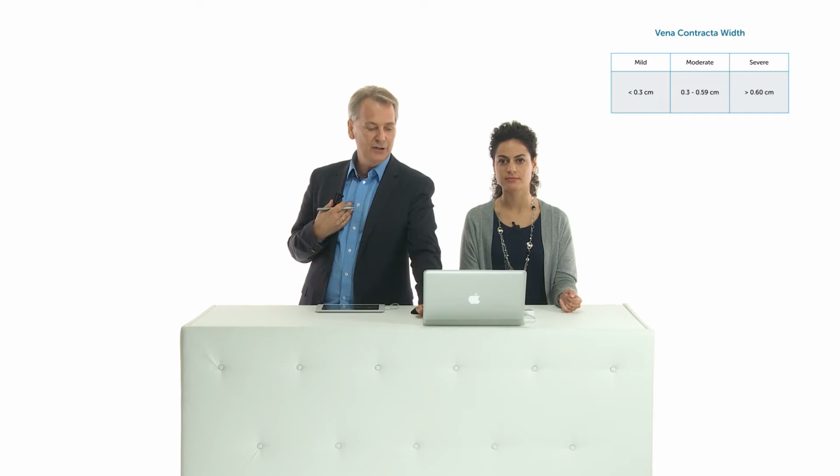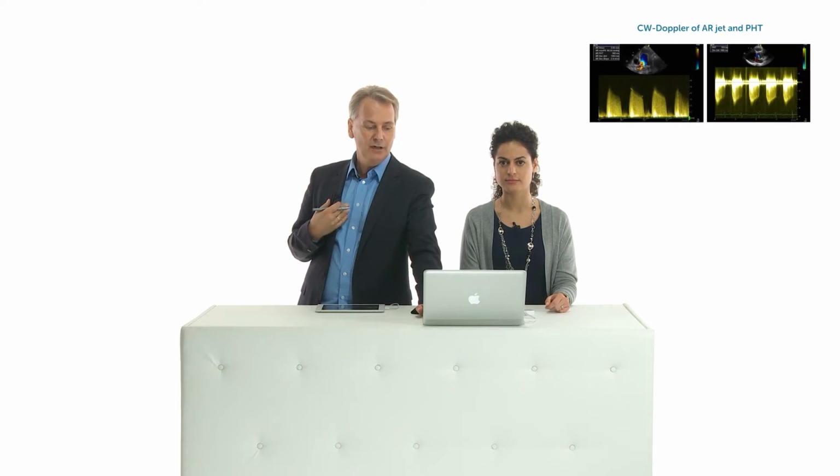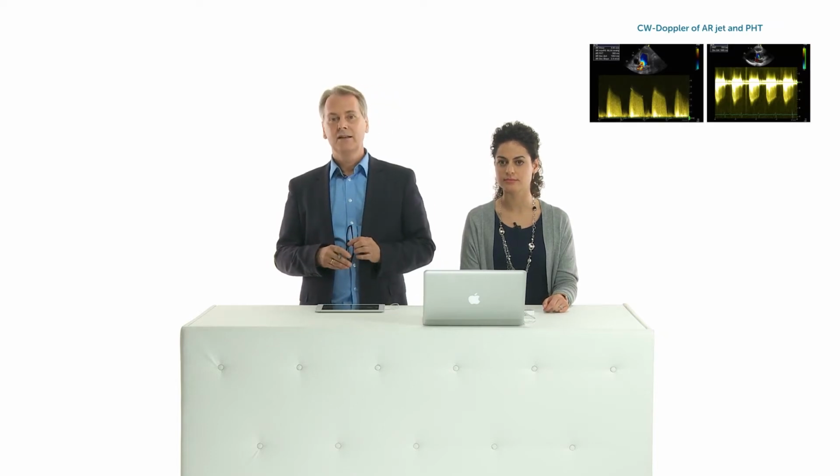Yes, that's why I would use it as well, and especially only if you have a jet which is easy to delineate, because remember what Anna said at the beginning of the chapter, the aortic valve is a complex structure and jets can come from all over the place, and sometimes you don't only have one jet but maybe several jets. So quantification is something which I personally perform a lot by using the visual assessment, only measurement in those patients where it's appropriate.